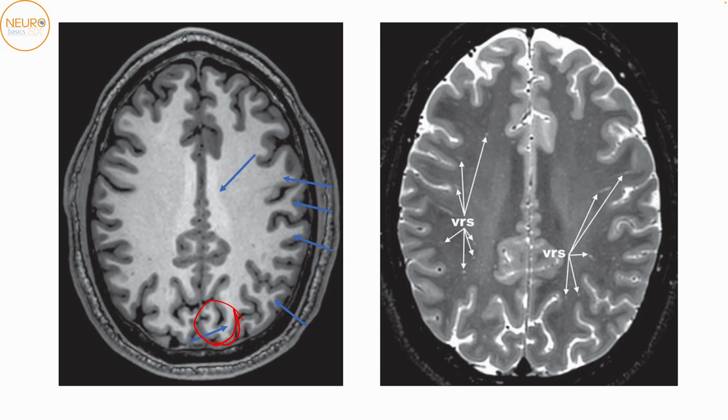This very plain, simple looking structure on the medial surface is the cingulate gyrus. This sulcus anterior to the cingulate gyrus is the cingulate sulcus. So this you can see is the cingulate gray matter. The cingulate sulcus will be running above the cingulate gray matter.